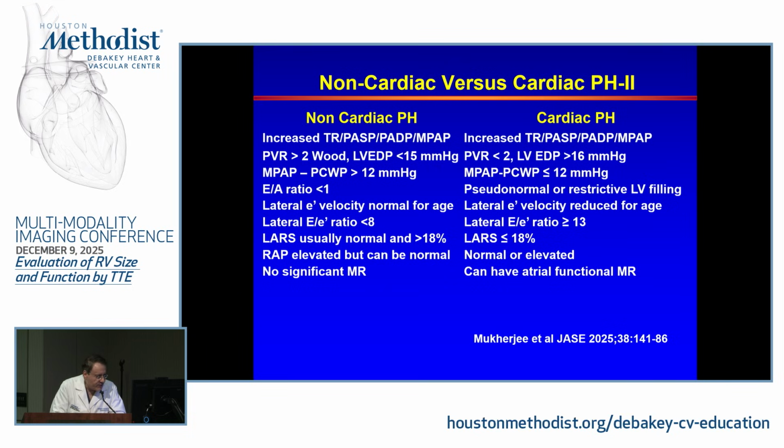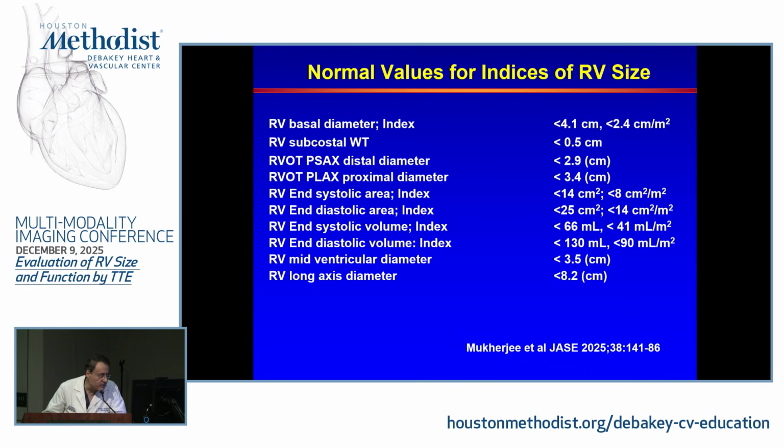And these are sort of hemodynamic and Doppler findings. Reduced LA strain and enlarged LA go with a cardiac etiology as opposed to a non-cardiac etiology.